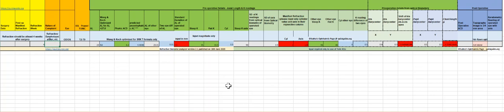So that was, in short, my first version of validating the biometric tool. I plan to make it more robust, adding more functions on the post-operative details. But as of now, I hope this biometric tool validating the biometry data will help you.